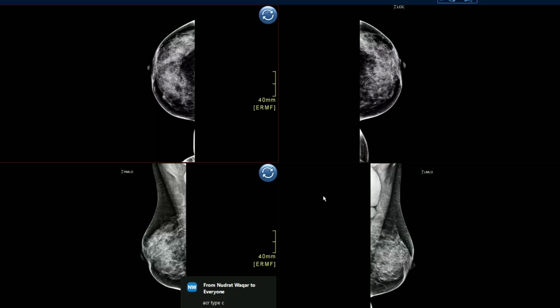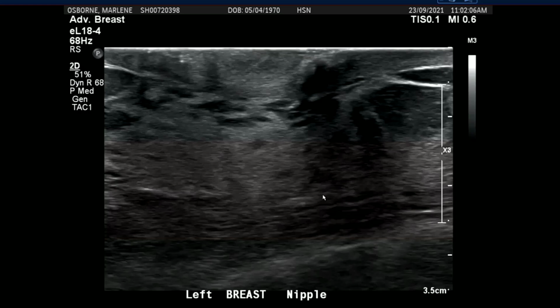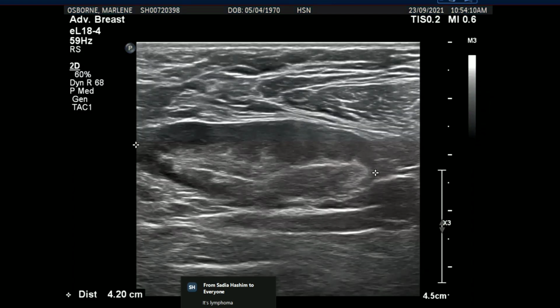And then this is left axillary lymph node. And then there is right axillary lymph node. So lymph nodes are abnormal, nothing in the breast. So what do you do to these? You BI-RADS them. So we're going to say BI-RADS 4C to it at least, because bilateral lymph nodes are abnormal, okay? So we BI-RADS 4C them, and then what we did is we biopsied them.